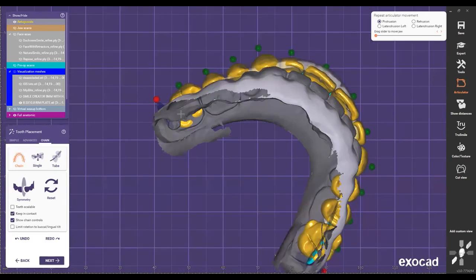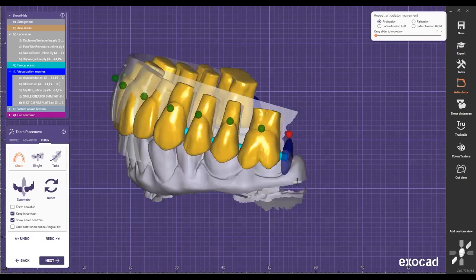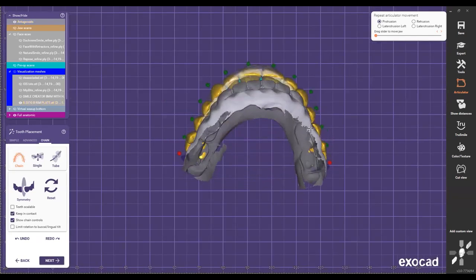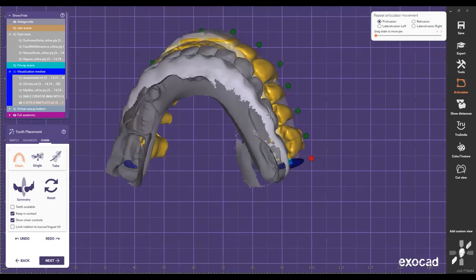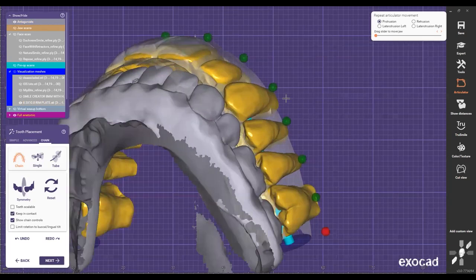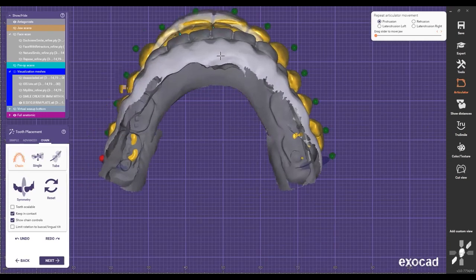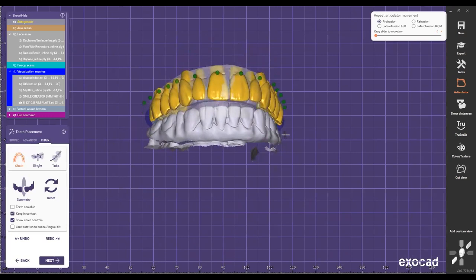I'm going to try to get a nice overjet there. I'm going to lift this here because I want to follow my plane, right? Pretty much right there. So then I have a nice occlusion, and I'm probably going to push them just a little bit to create a nice overjet. That's important to know too: if I leave an edge to edge, the patient is going to bite the lip, the cheeks, I'm sorry. So now I'm going to turn this off because I want to move them a little bit forward based on my wax rim, or my pre-op right there.